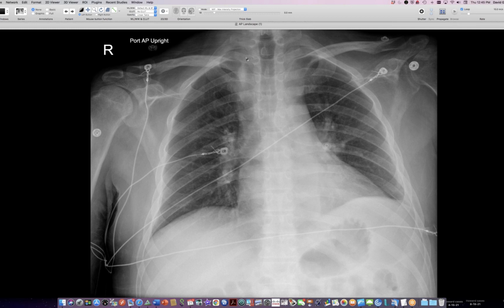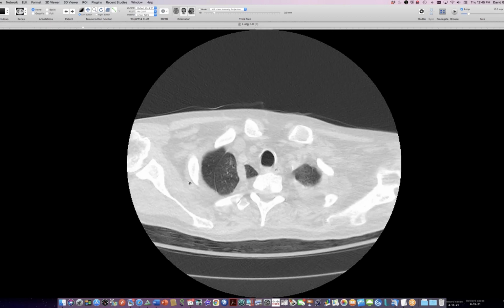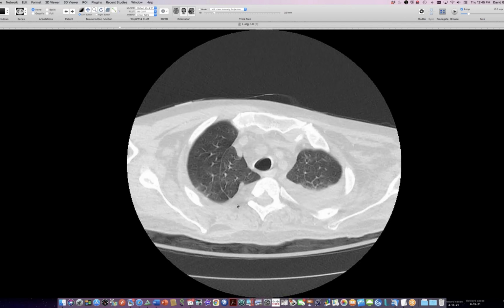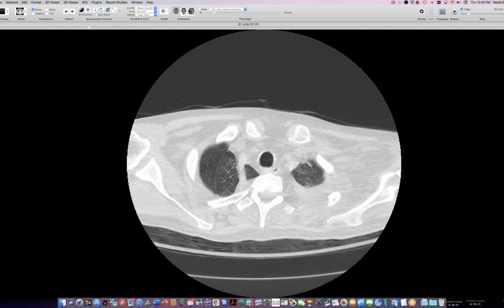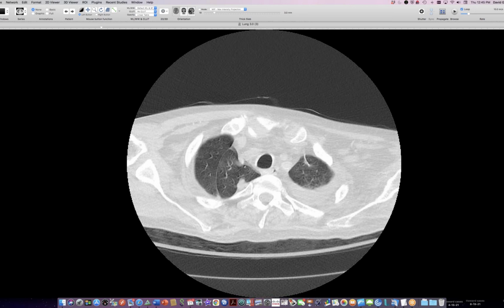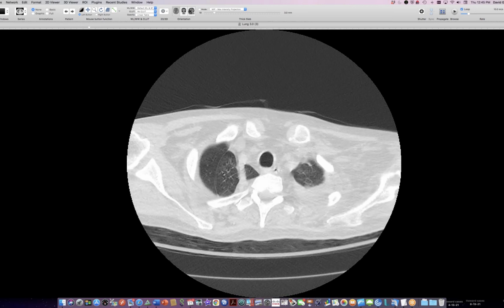Okay, this person has a subtle azygos lobe up here on this radiograph, and then on CT, here we have the azygos vein, and then here we have the fissure. So this vein belongs in the fissure, and it's not there. So this is a case of empty azygos fissure. We do have an azygos lobe, and we have the vein somewhere else.